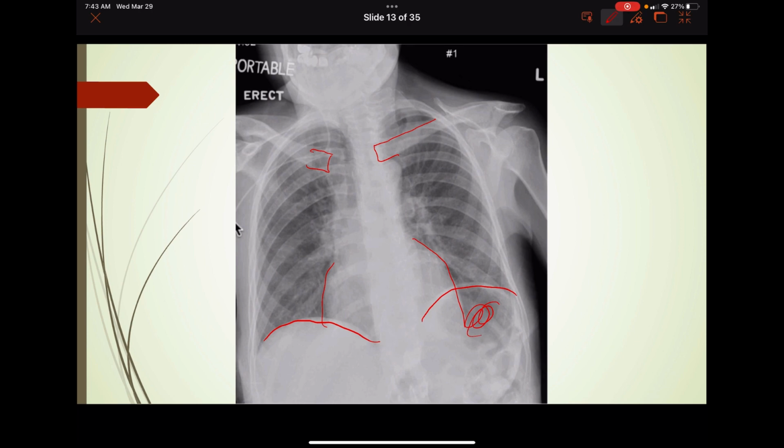So he does have a line, and it's coming here. It's probably a PICC line, but it made a turn and it went up into his neck. So obviously that's misplaced. They're going to have to, depending on if they're done or still sterile, etc., either back that out and re-advance, or replace it altogether. So, yep, that needs to be dealt with.